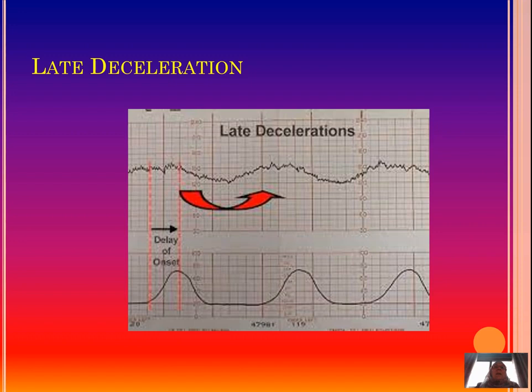Here's another CTG of late decelerations, and you can see the deceleration is well behind the contractions. And again, you see late decelerations occur after every contraction.